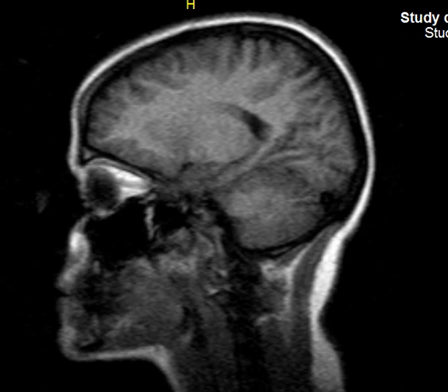Today I chose to talk about brain anatomy, MRI based. I will not make slides and PowerPoint and some boring stuff that will make you all asleep by the end. We'll do something interactive: we'll have a brain MRI and we'll just talk. What's this? What's that? And I'll try to incorporate some of the MRI physics into the anatomy that we see, trying to make sense of all of it. If you have any questions, we can answer, and I hope you'll have fun. Okay?